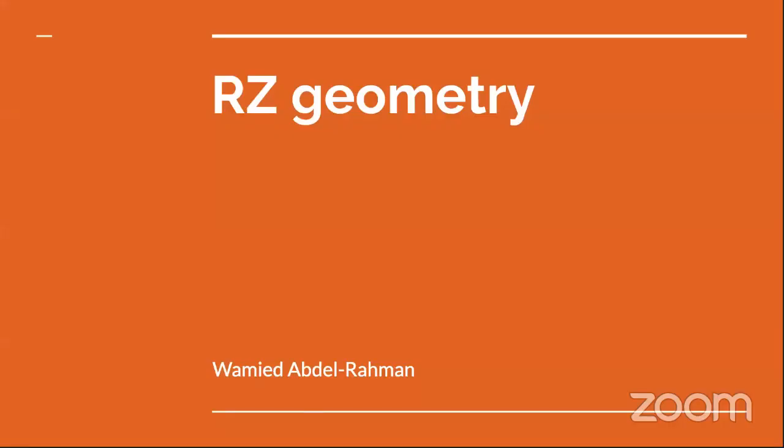Okay, so let's see if we can get it back. Okay, can you see now the presentation, the RZ geometry? Yes, it's there. Yeah. Okay.